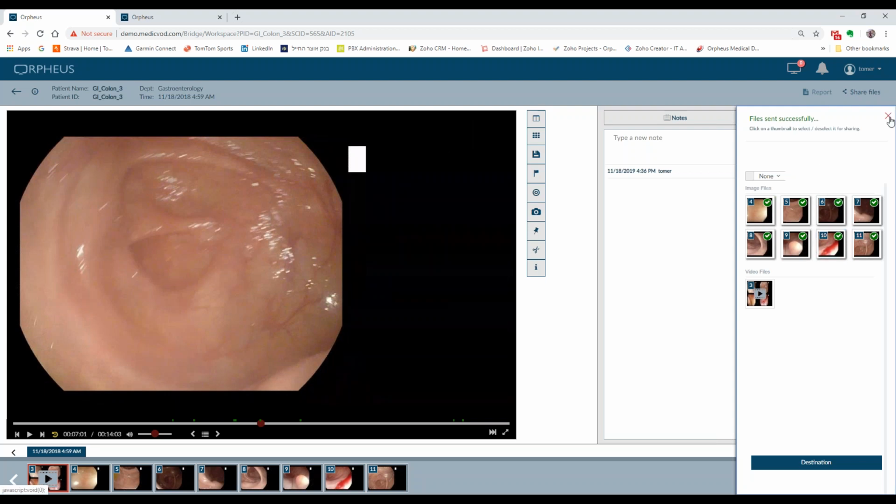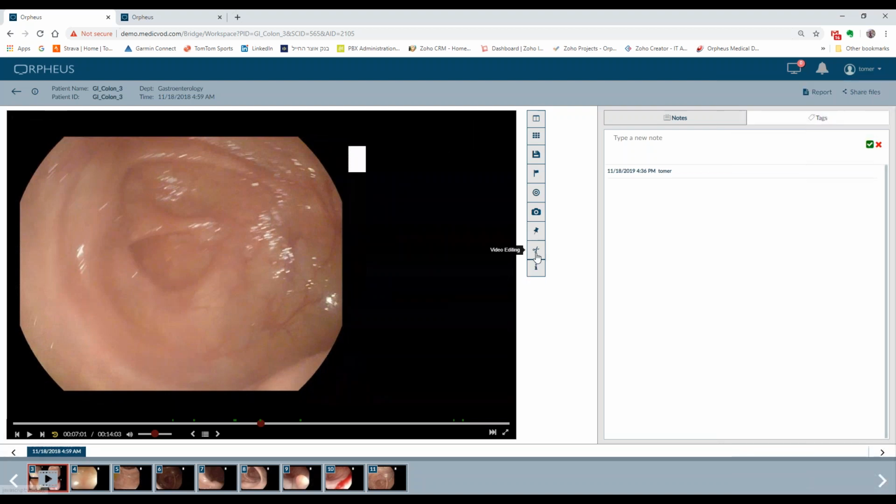And that's the idea. So that if there's an outage on any side of this interface, you know how to restore those images back to AGFA EI.